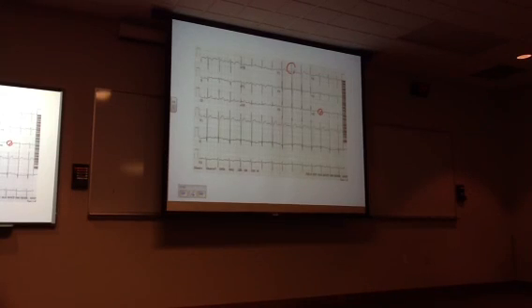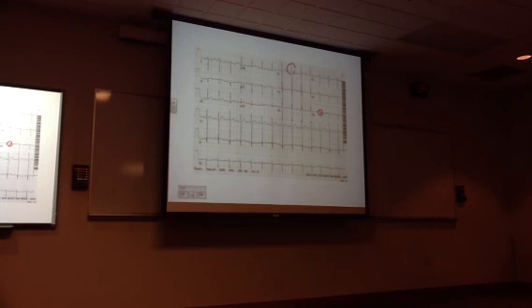The other possibility is that you guys put the leads on wrong, so we switched right and left. Did you get that? We all three got the right answer. Did you do that upstairs, put the leads on wrong? All right. If the EKG technician puts the right arm on the left arm and vice versa, then I'm going to see the same thing. I lost my thumb drive this morning, or I didn't bring it. I had a picture of the dextrocardia on chest X-ray. So this guy actually did have dextrocardia.